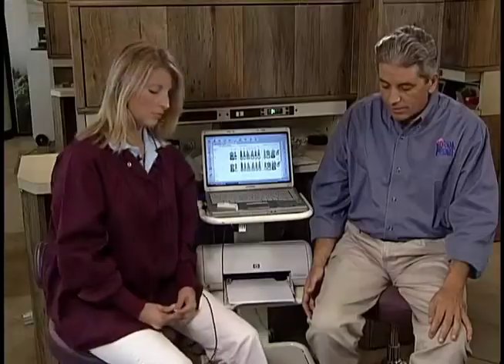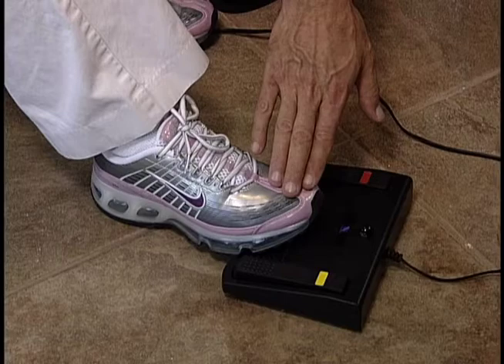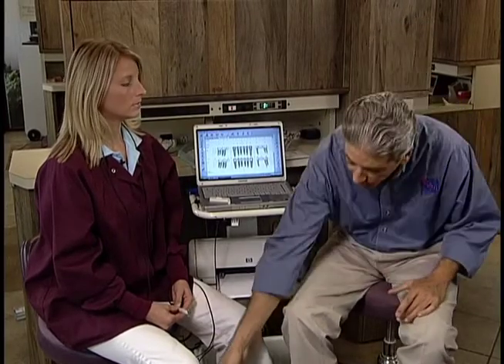Okay. Now, I want you to rest your foot and close your eyes. Just feel that foot pedal. Lower arch. Do you see how little movement it really takes? That's going to do a couple things for you. It's going to minimize you moving around to the foot pedal and misstepping, but it's also a lot less fatiguing on your leg over the course of the day.